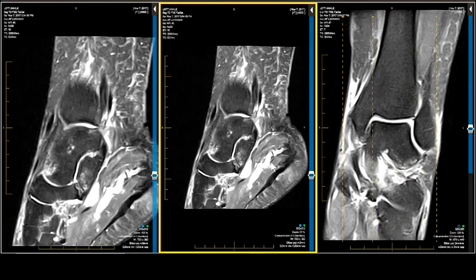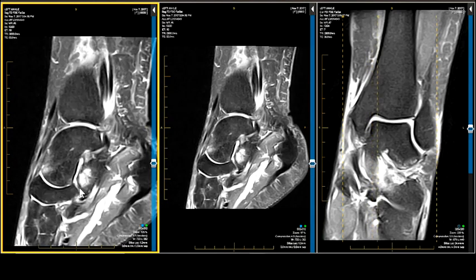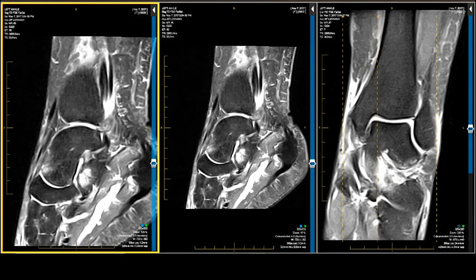So what's the main problem that led to all of these crazy findings? There it is, right there. Fibrocartilaginous calcaneonavicular coalition. And having that for 58 years, that could do it. And it did.